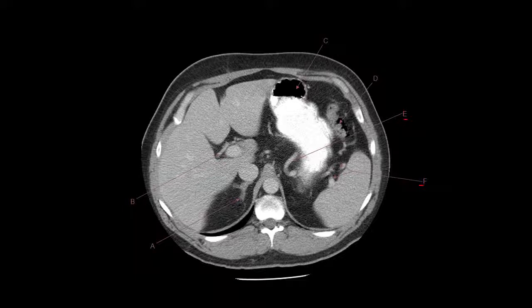D. We look at that. What do we have? Well, we have a structure that is like this. It's on the left side. It's near the spleen and stomach. There's air in here. We know that because of the black stuff. And then there's different variations of color in here. Some very solid, some not so solid. That's bowel, and we'll talk about it in a second.